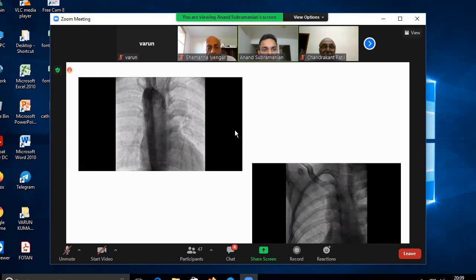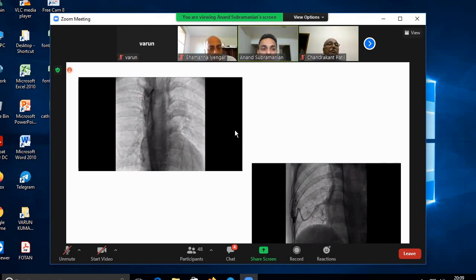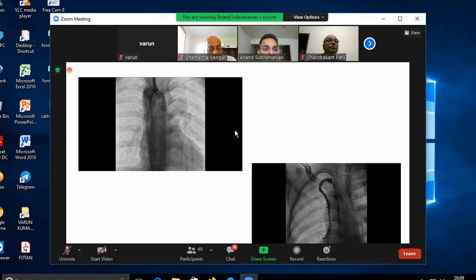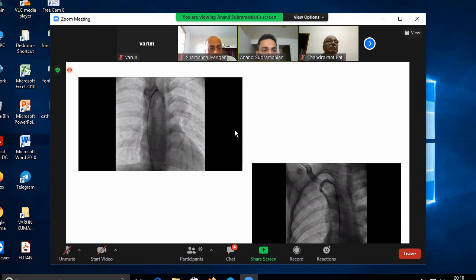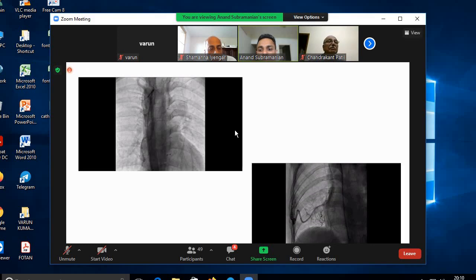Now, if you look at this angiogram over here, this was a descending aortogram. When a child grows old, especially in a 13-year-old or an adult tetralogy or a VSD-PS, if he's blue, you expect that collaterals should have developed by this age. And it's important to look at collaterals because they will flood the field at the time of surgery. Even if the surgeon manages to somehow complete the surgery, post-operatively it's going to cause issues in terms of persistent pleural effusions, probably re-intubations needed because of that, and prolong the ICU stay, basically.